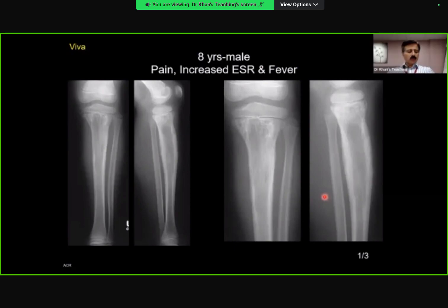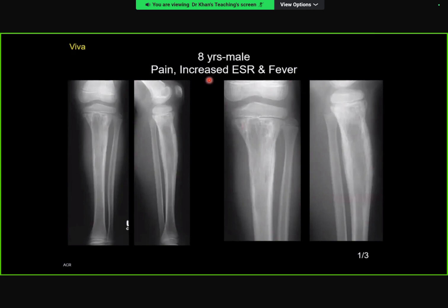Overall, your conclusion. So I'm cutting you because of the time factor. Aggressive lesion, and I'm concerned with the fever about osteomyelitis, Brodie's abscess, septic process. I would call for an MR. Okay, I don't have an MR, but I just want to ask you differential. So you have talked about aggressive process, absolutely fine. Infection, absolutely fine. What else? So since it's ESR, pain, fever. Okay, so it can be a malignancy such as osteosarcoma or Ewing's, Langerhans cell histiocytosis.